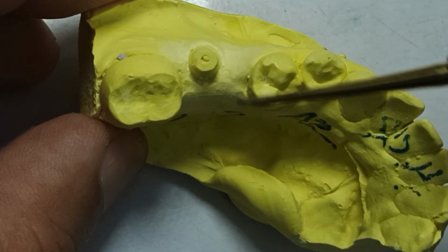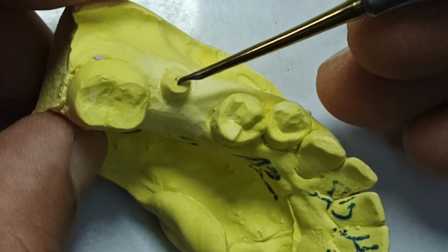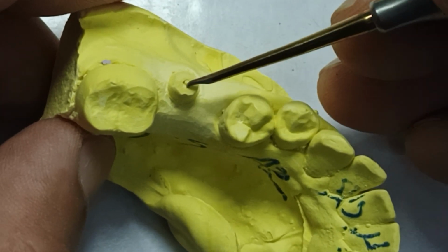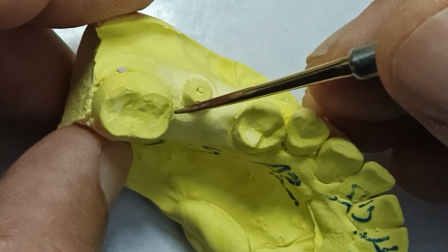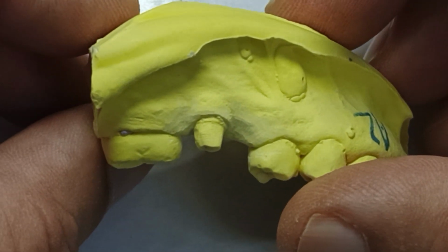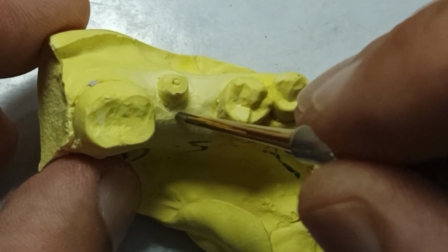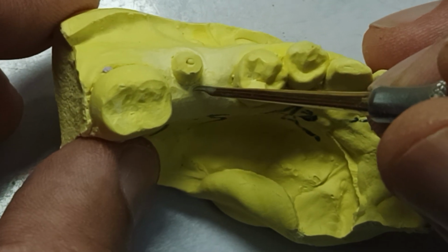It is so unfortunate. Now it is sent to the laboratory to make a crown which is going to be lopsided. And if this was placed in the middle and they wanted some accuracy, they should have sent the actual abutment so the crown will be made fitting. There is some space right there, but there's too much space right here. It's lopsided mesiodistally, and facial lingual is totally in the off zone. This should have been the center of the implant. All they had to do was draw a line right there and draw a line right there and place the implant right down the middle. So we'll put this aside.